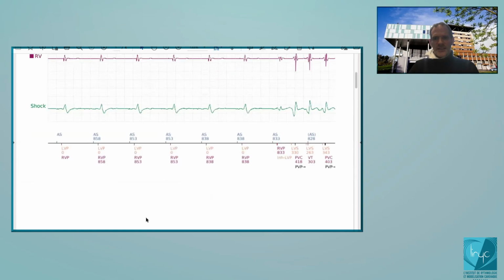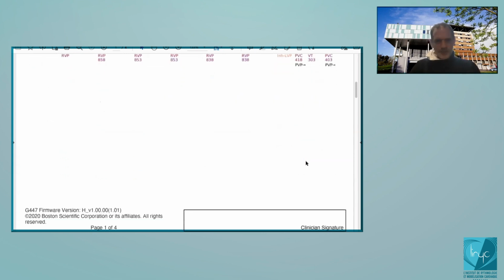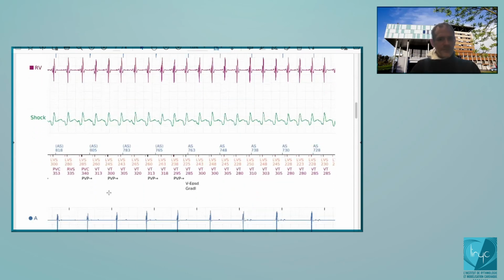Just to show you that this one will not be integrated in the counter of 8 out of 10, since this one is slow. So you first require 3 consecutive cycles. So there is 1, and then here you do not implement these 3 consecutive counters. So this one will not count. And then you arrive here, and then you have 1, 2, 3. So now you have the 3 consecutive, and 1, 2, 3, 4, 5, 6, 7, 8, the episode.